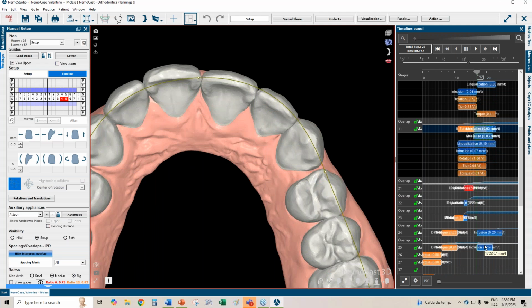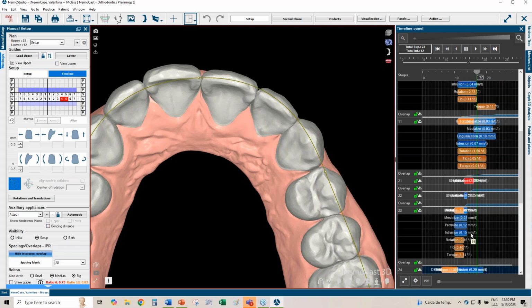Okay, let's do both sides right here, because for example these two, I'm going to need to perform them earlier, or actually get rid of them whatsoever. That's going to be useful as well. But let's focus on the canine.